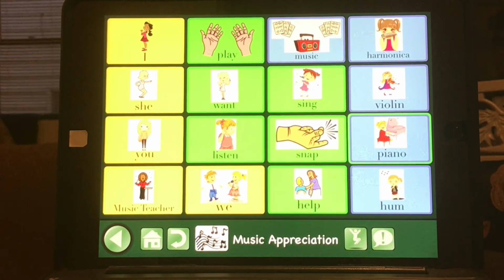So as the client progresses, more tile locations could be added to allow for an increased vocabulary and detailed conversation while utilizing the GoTalk Now app, which could include other lexicons from categories such as prepositions, modal verbs, and more adjectives. In addition, once the client acclimates to an increased level of use, the program has a quick core vocabulary button that allows for the insertion of up to 4 keywords or phrases that the client could access at any time without needing to actually navigate between pages.